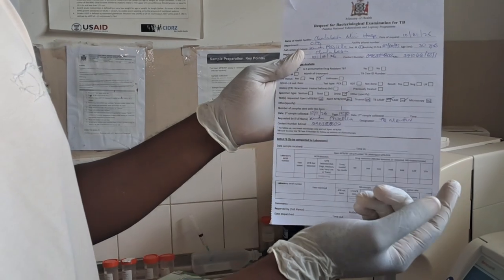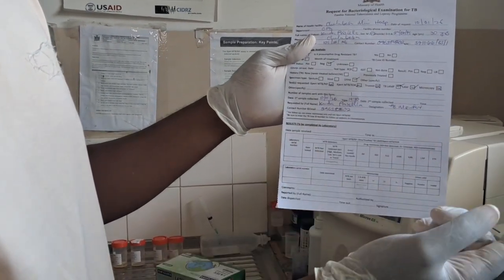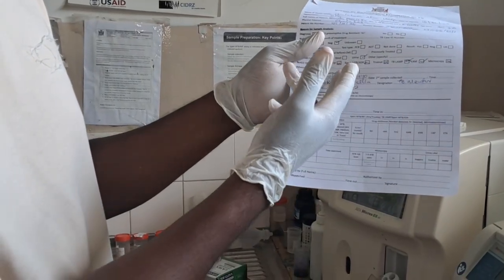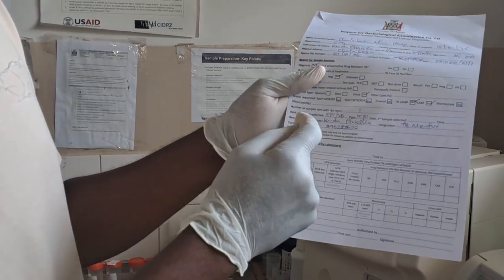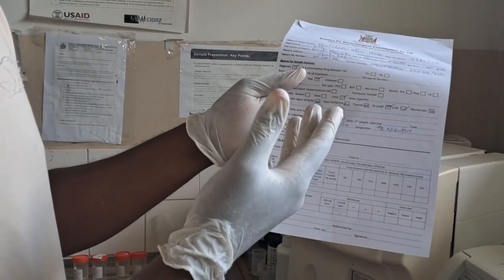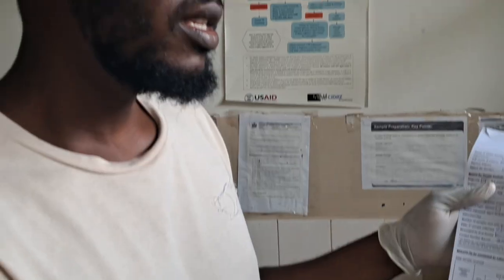Here, we are not doing Xpert. We are doing LAM, so you tick on LAM. Then how many samples have you sent and how many forms? You have sent one, you tick on that. Then the date the sample was collected and the time. Most of the time we tend to miss these, but they are very vital to know how long the sample has stayed. This is how we know at the lab how viable the sample is.